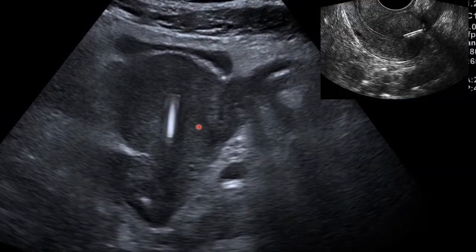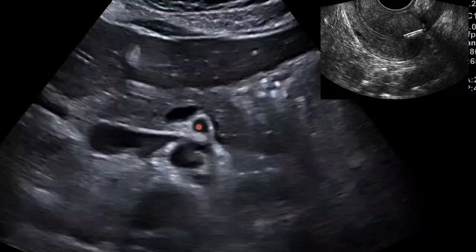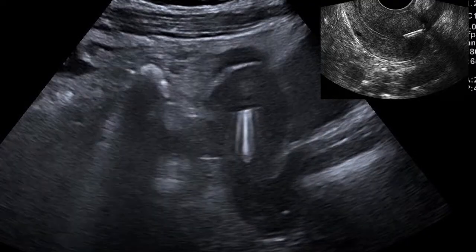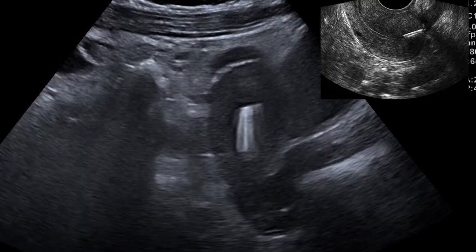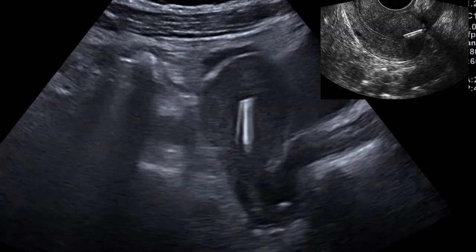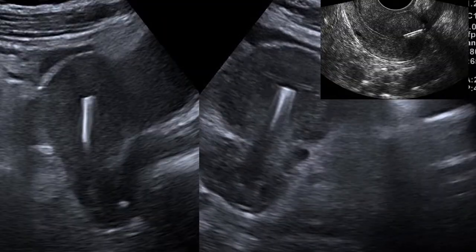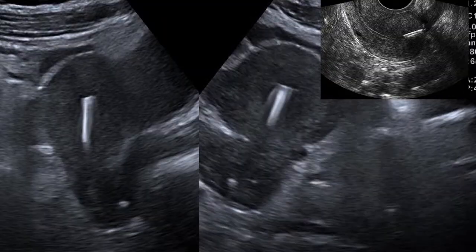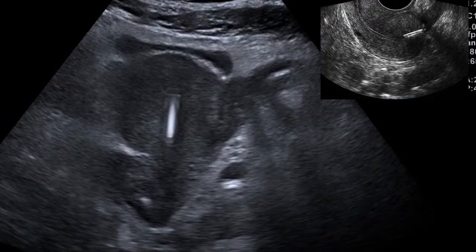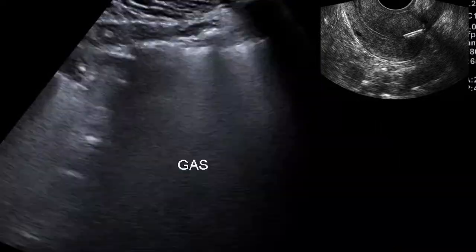So my advice to you, ladies and gentlemen, is you must avoid bias. Many clinicians immediately blame the IUCD for a crime that it never committed. When a patient presents with pelvic pain, a normal IUCD does not automatically mean it is responsible for the symptoms. So the role of ultrasound in the evaluation of an IUCD is to evaluate the uterus, the ovaries, the adnexa, the cervix, the cul-de-sac, and the urinary bladder for any other pathology that might be causing the problem before concluding that the IUCD is the cause.